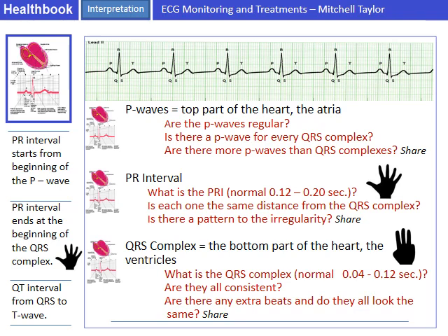And so we stretch out our hand, with that kind of gang sign saying, 5 fingers show me 5 boxes from the P to the QRS complex. If it's more than that, then it would be extended, or something's blocking that, or damage or something has occurred that we don't know, that is extending the normal time from the SA node to the AV node. So we're going to measure this PR interval and see how many boxes we get. Well, it starts in the middle of a box.